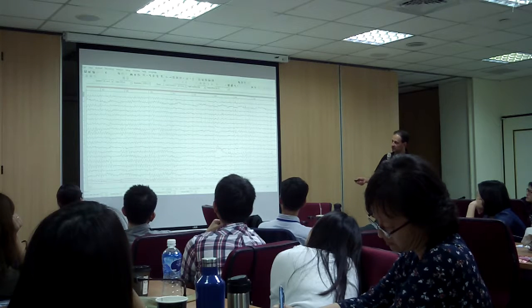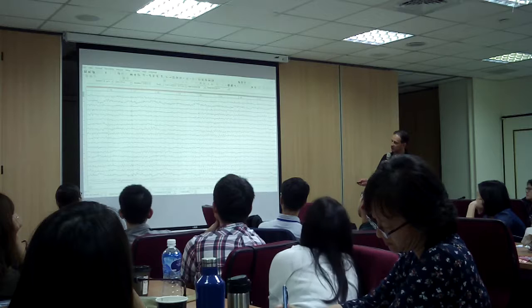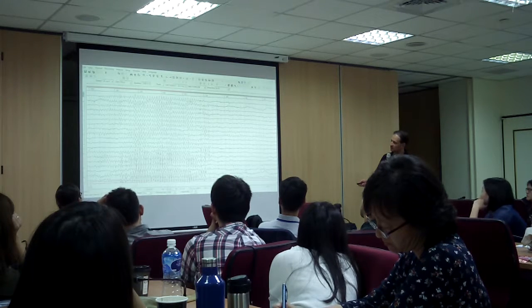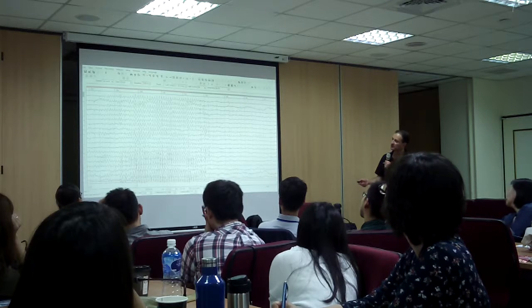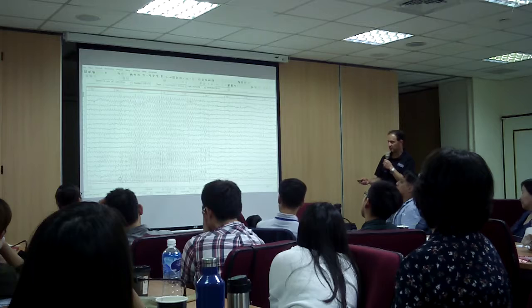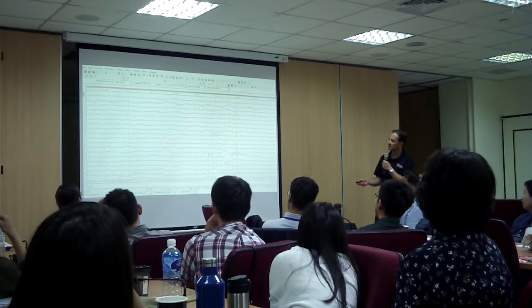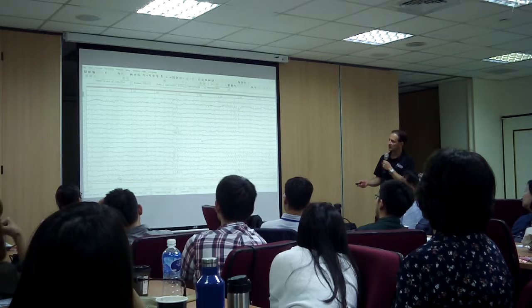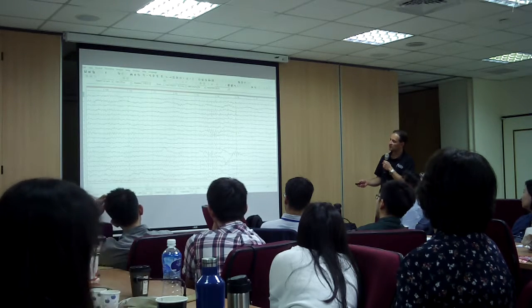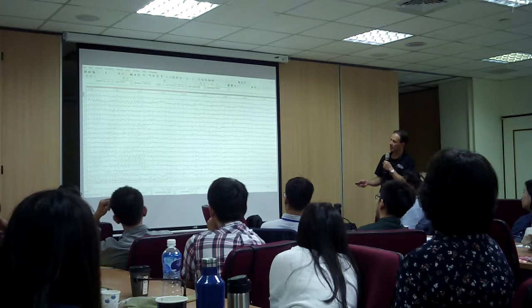This is sensor pop. That's an artifact. So keep moving. Yeah. Another one. So you're seeing the picture. That's good. You're starting to get the idea. And there is again. Yeah. And that's a sensor pop. Again, that's our artifact. It's movement. But you get the idea.